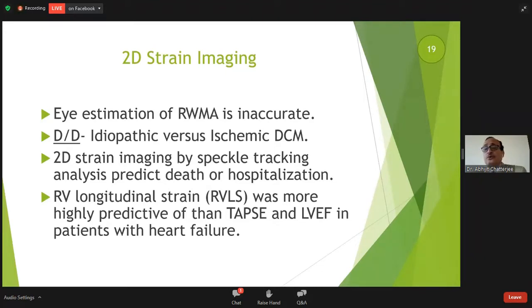You know, the computer selects at random some dots or points on the myocardium, and by a mathematical technique known as fast Fourier transformation, it goes on chasing those dots as the heart moves back and forth during systole and diastole. It notes the distance between the two dots in systole and diastole.